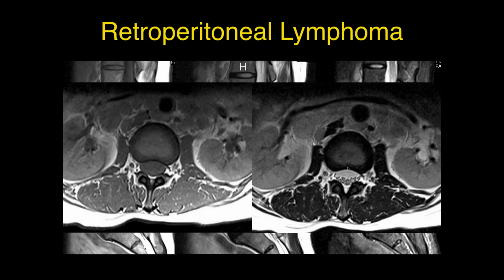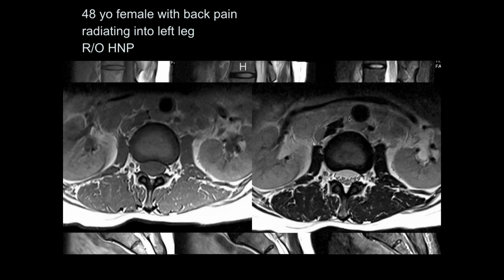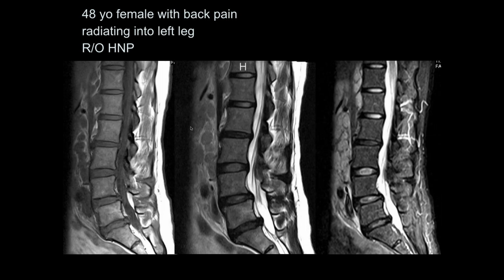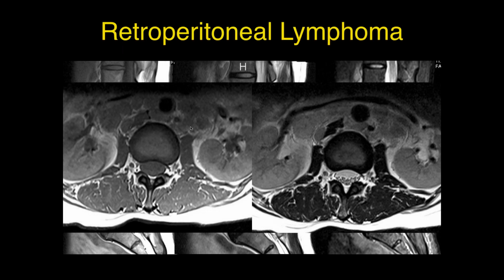Okay, so you're the kidney. This was a patient that I actually read, and the surgeon called me back the next day and said, what about the retroperitoneal lymphoma? So this is just to remind everyone, and this is what started me having a paragraph in all my reports evaluating the retroperitoneum. What did you say, John? What about it? I didn't comment on any abnormality in the retroperitoneum. And when he said, what about that, he said, let me go back. What about it?